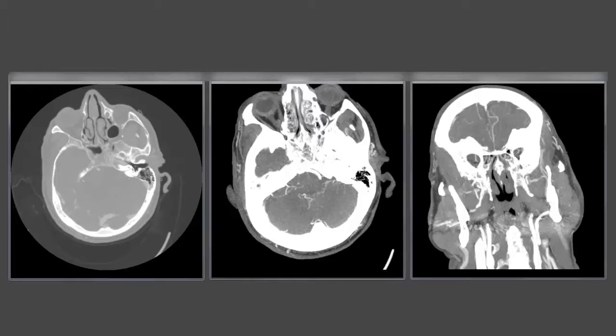So this patient came in with a left MCA syndrome, a right hemiparesis, and aphasia, and a left gaze deviation. Knowing this information, obviously our focus is on the left MCA territory, but we're going to have to remember to cover all of the vessels of the circle of Willis, all the large artery potential occlusions, as there may be more than what we're expecting.